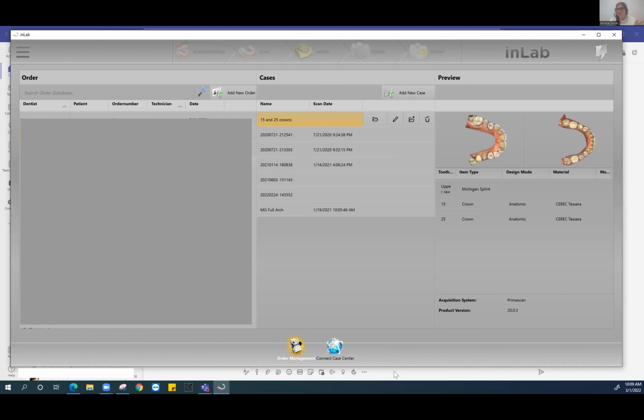Okay, so go into the Connect software as you normally do, open up a pre-existing case, but now when you direct it through to the portal, you're going to see yourself as an option under the laboratories. Select yourself, submit that cart, and it'll come through to the portal.